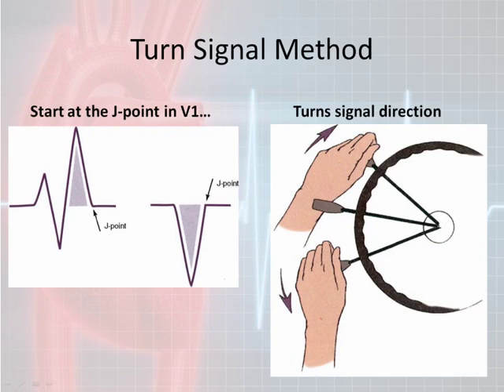Now I'm going to show you the shortcut method. I always show you how to determine this stuff using the normal long way before I teach you the shortcut. Like I've said before, if all I teach are the shortcut methods, then when people get out into the healthcare field, working on the ambulance or in the hospital, they're going to shortcut what they learned, which was the shortcut method. So basically you're shortcutting your shortcuts. If you learn it the long way, at least you'll understand the shortcut method. So let's look at the shortcut method.